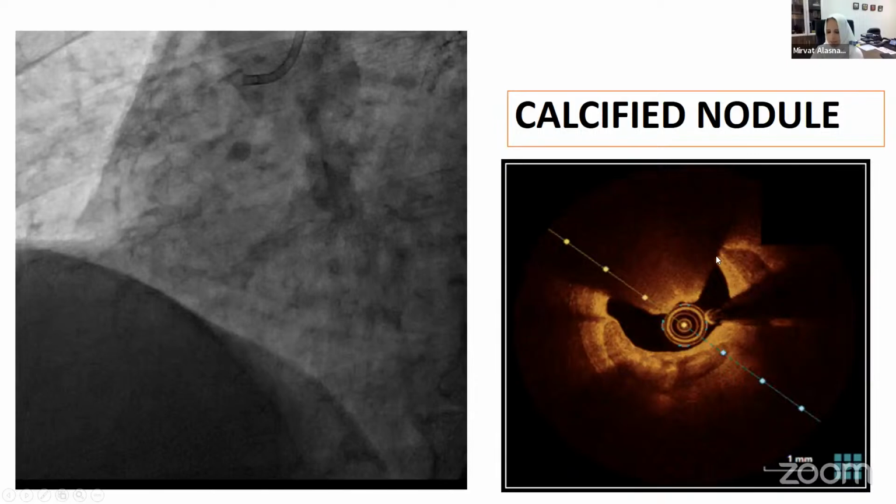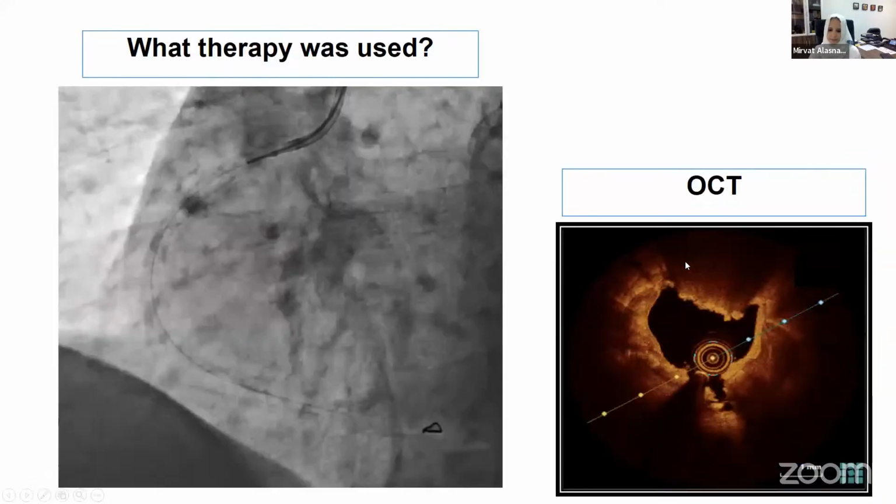I'm not sure if you can see my arrow that I'm using to point, but it's going to be at these edges. So you may end up having fractures there, and with more dilatation, it just keeps yielding and yielding until you get perforation, but the nodule hasn't been modified yet.